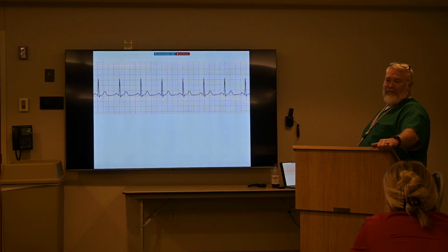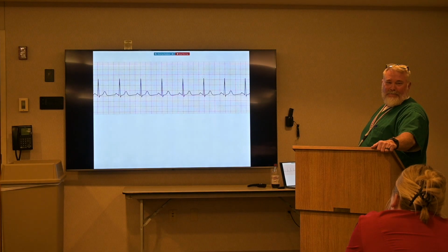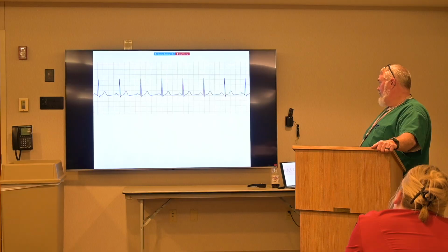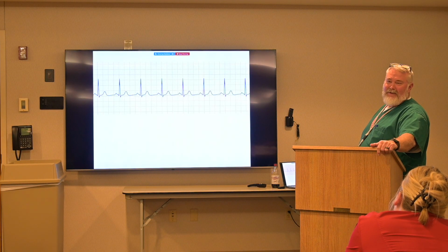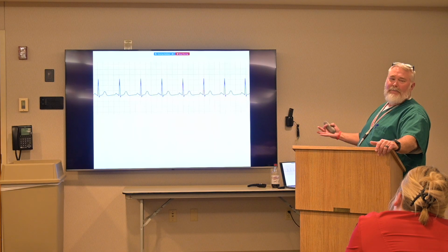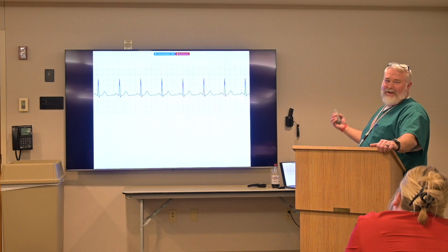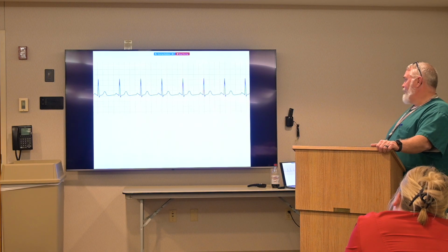And what about this one? I'm not trying to trick you. It's about 80 beats. It's sinus. I wanted to see how many people say PEA. It could be PEA, but to me it's too fast for PEA. So that's just normal sinus rhythm.